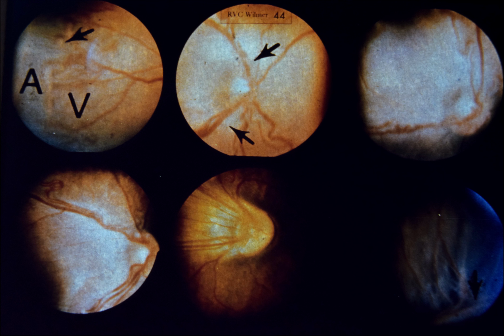Lower center, 2 months later, additional traction from temporal periphery has produced the classical dragged disc, or as more appropriately designated by Tasman, the dragged retinal vessel appearance. This results in marked temporal displacement and heterotopia of the macula with serious visual impairment. Lower right, left eye of same patient with cicatricial stage 1 RLF. Arrow points to elevated ridge of tissue at site of proliferative lesions.